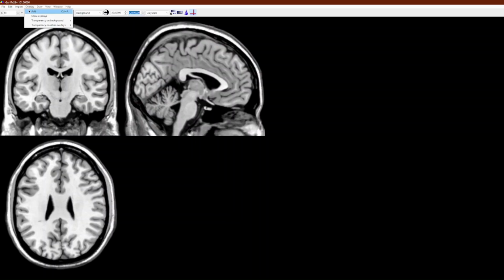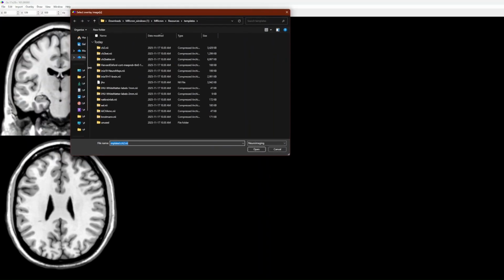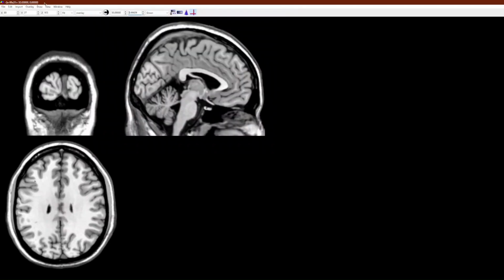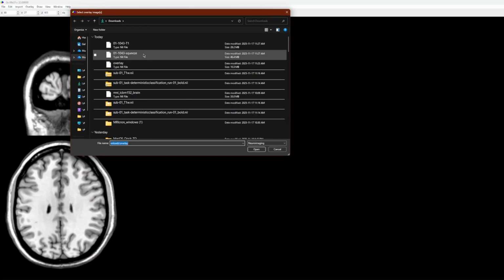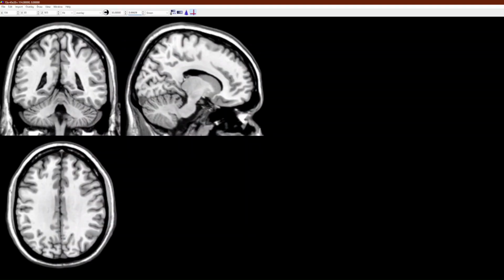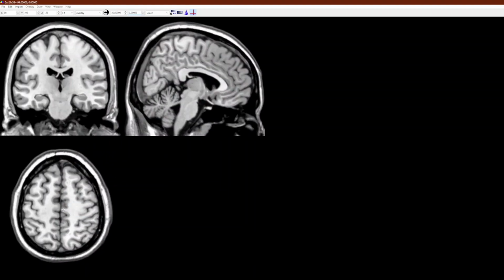So for example, I have an example overlay that I'm going to put on, and you can just see what changing the threshold does. This example overlay is a drawing, so it's not going to have different intensities per se, but it will be useful. What just happened? Add overlay. Okay, yeah. So as we go through this brain, I think we'll see the overlay in a little bit. Should be here.